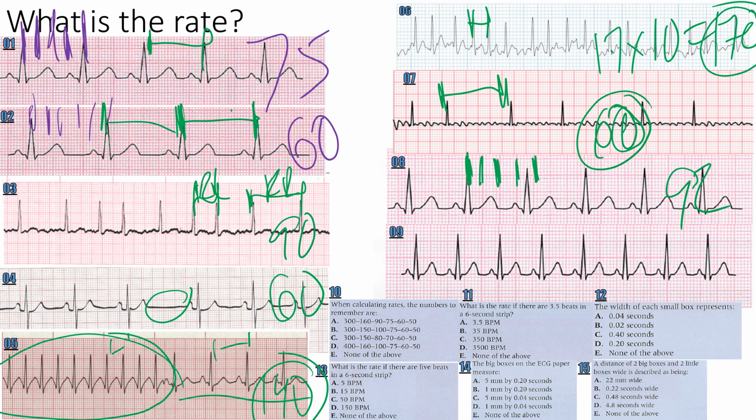Next one looks a little bit faster, so it's probably a sinus tach, but how fast is it? Is it upwards of 150, where I'm concerned that they could be at risk for some hemodynamic compromise, or is it maybe a little bit stable? All right, so this one lines up nicely, right? So what's the next box? If there was a QRS complex right there, heart rate's 300. If there's a QRS complex right here, heart rate is 150. If there's a QRS complex right there, heart rate is 100. So the heart rate is between 100 and 150, about halfway, about 127.